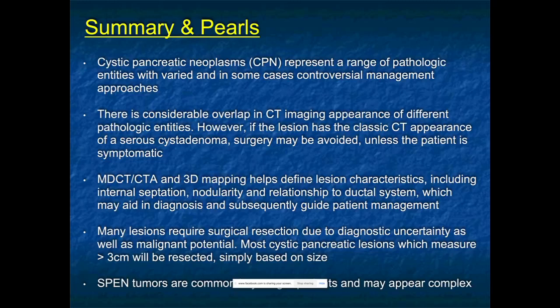So I've quizzed you. We talked about cystic pancreatic lesions. We looked at a number of the lesions, some of the challenges in making that diagnosis. In CTisus, there's literally thousands of cases. Lots of text, lots of quizzes, all in this topic because we have this on a daily basis. I see multiple cystic lesions on a daily basis. I think 3D is helpful. We've shown some of that. An article was just published, I think a couple weeks ago, talking about that as well. And it's a real diagnostic challenge.